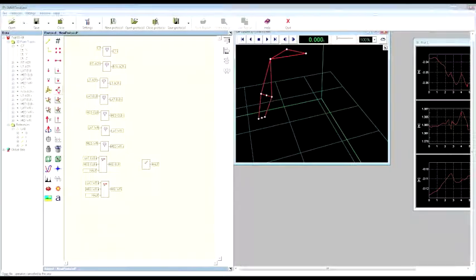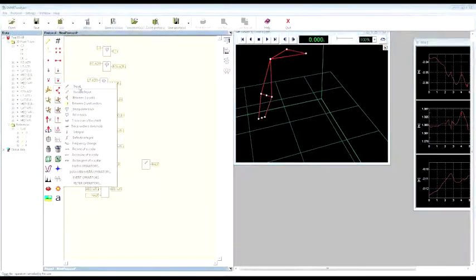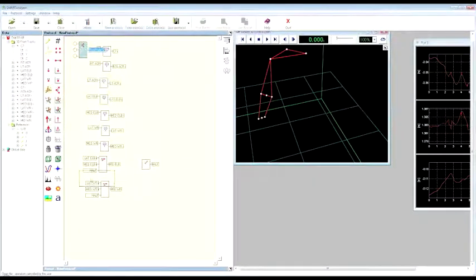In this lesson we will just talk about 1D kinematics. So I can click on the 1D angle operator, and within the list you can choose between two options. The first is for computing an angle between 3 points, and the second is to compute an angle between two unit vectors, so two vectors. The results will be the same, but I'm going to use the first. So I want to compute the angle between 3 points.